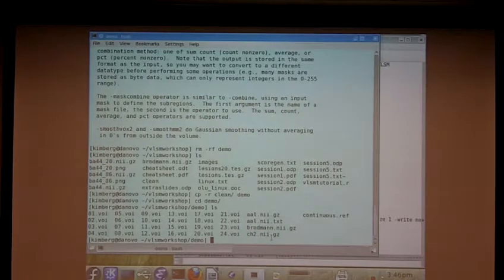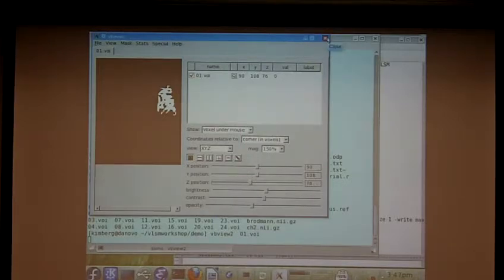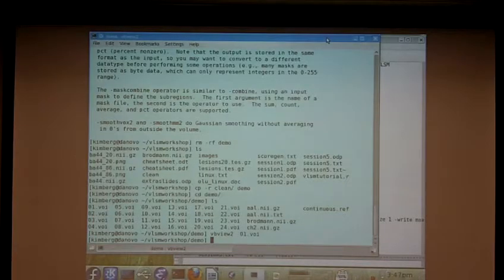So this is what we're starting with, and you can see right away this is enough to do a VLSM analysis. We have 24 brains and one dependent variable, and each of these VOI files, we can look at one of them. With VoxBo view 2, each of these VOI files has a lesion in it somewhere. Chris generated these for MRIcron as a demo. He generated them artificially by creating circles, spheres, and masking them with gray matter, I believe. It's as useful as anything else to demonstrate how this stuff works anyway.